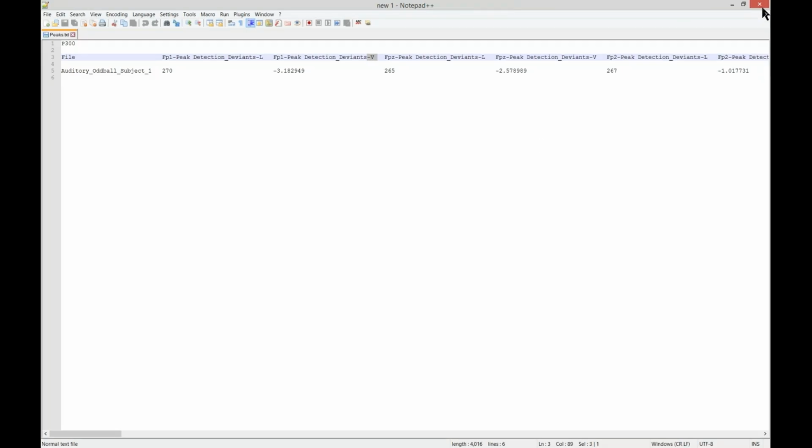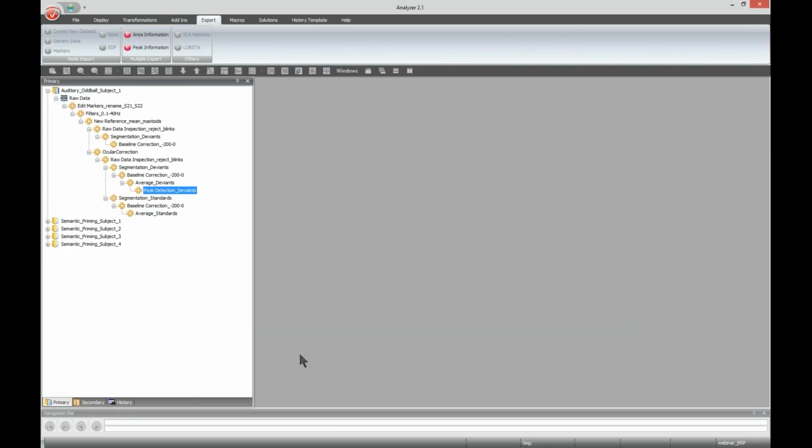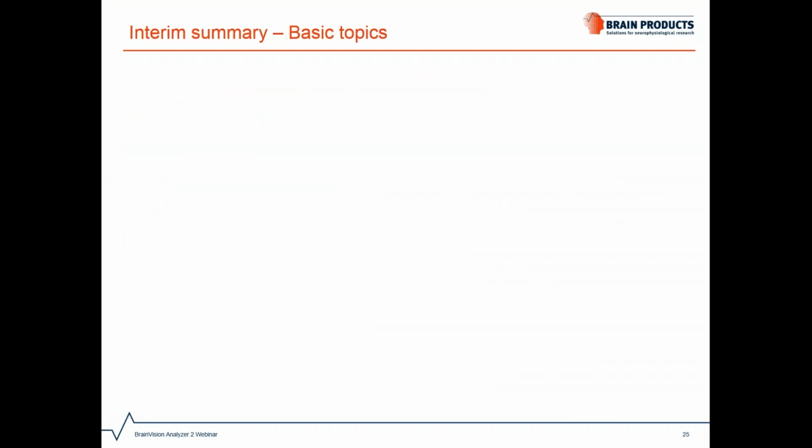Okay, let's close it now. And actually, we're done now with our first ERP analysis. And I would say that was rather quickly, right? Let's therefore go back to my slides to recap what we did.